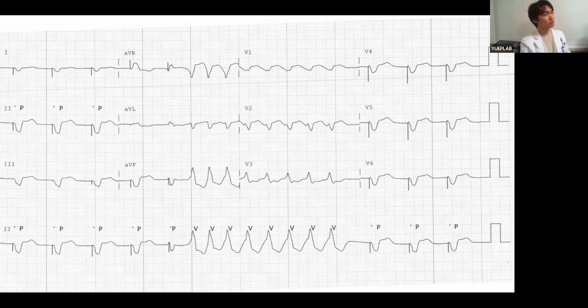This looks like a small P wave. Yeah, but because this is a telemetry ECG, I cannot clearly define the P wave. But as Georgia mentioned, this one and this one are a little different. And if you see some notching on the P wave contour, it could be an overlapping P wave. Okay. If there are no further comments, okay.